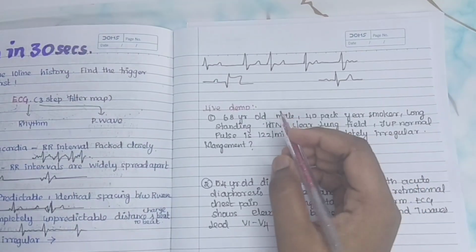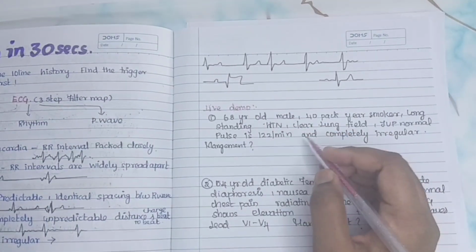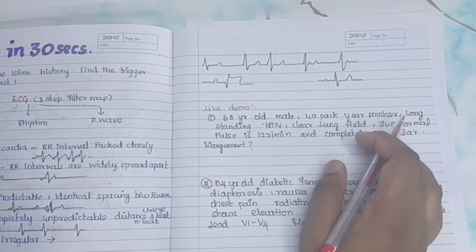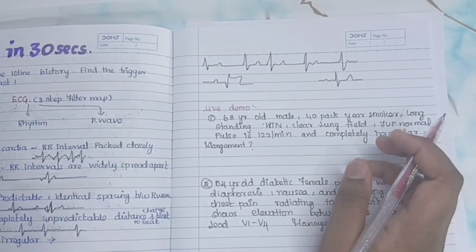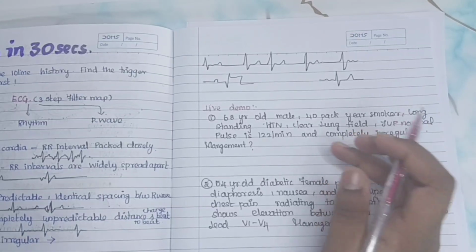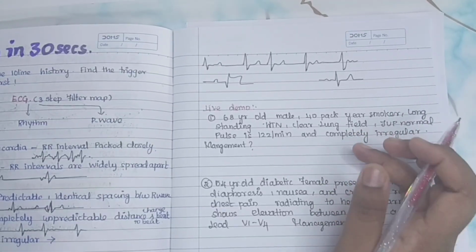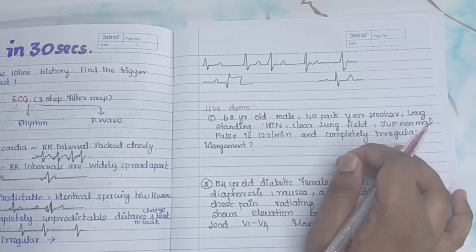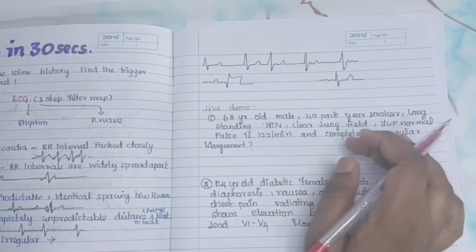Look at the typical exam pattern: a long page of clinical history, a confusing rhythm strip, and four options that look exactly the same. Under intense exam pressure, this is where panic starts in, and you waste 3 minutes reading the same long sentence twice. Stop doing that. Welcome back to Increment, where we slice through the clinical clutter.